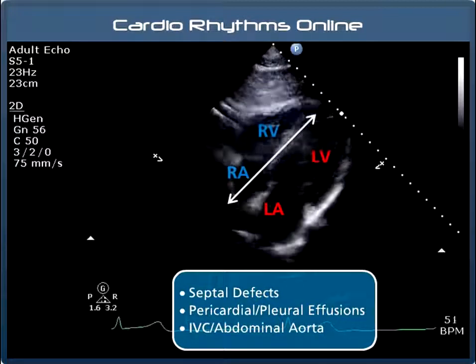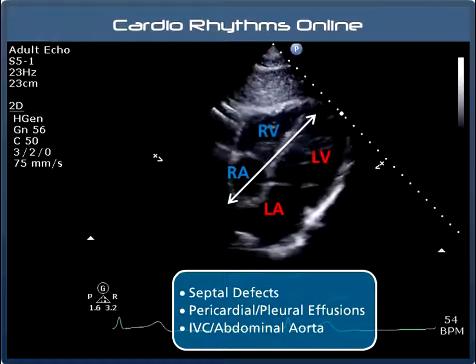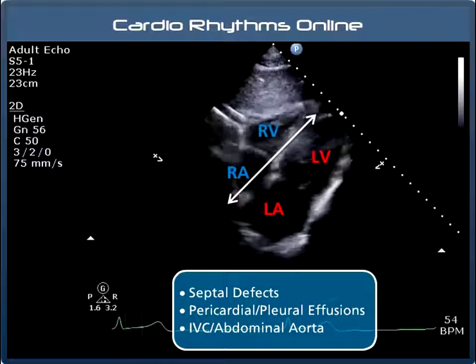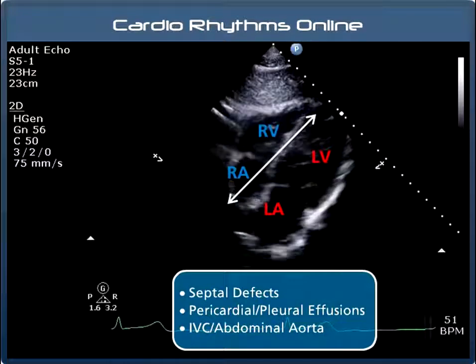I have to say that if you work in emergency care or if you happen to have someone with a misshapen rib cage, a subcostal view may be the only view you can obtain, so we often use it as a modified alternative to the standard parasternal and apical views for assessing structure and function.